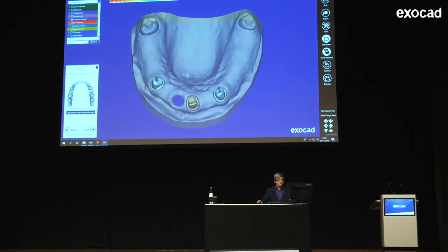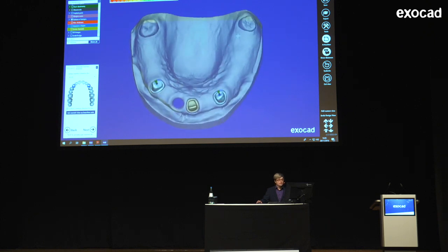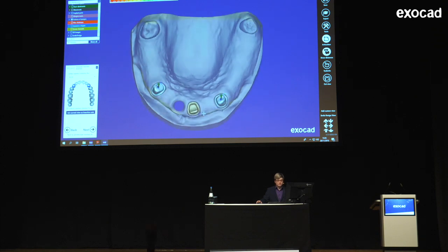And here, if I'm making the model a bit transparent, I can actually see undercuts here. Because at the end, I'm going to place clasps here. But you also see, I can't really get undercuts on this teeth without tilting the model completely. And this is not a good insertion direction. So I'm choosing something like this, where at least here I have some. And they're also a bit in unison with the dies themselves.